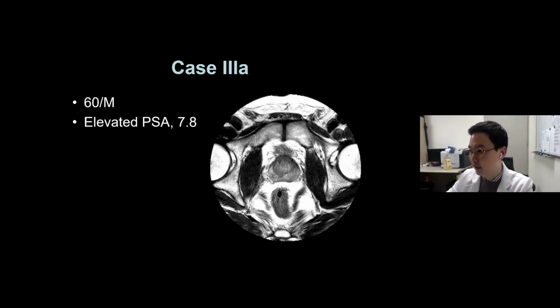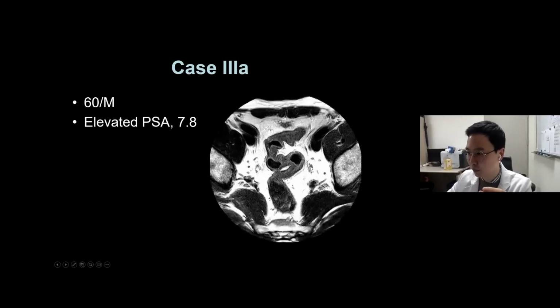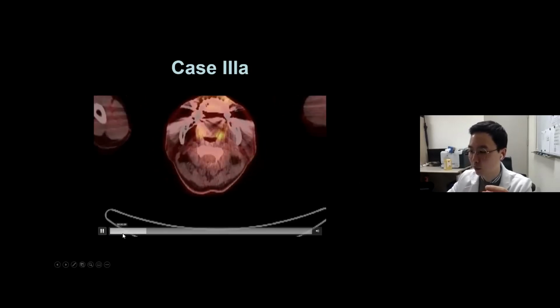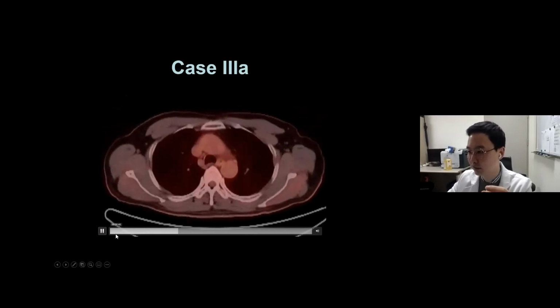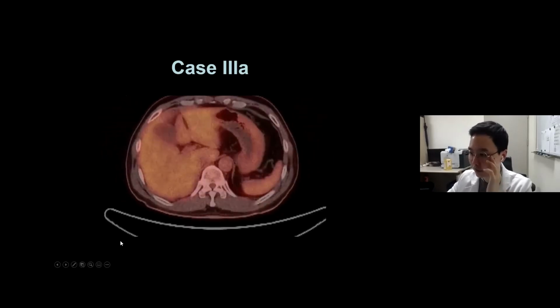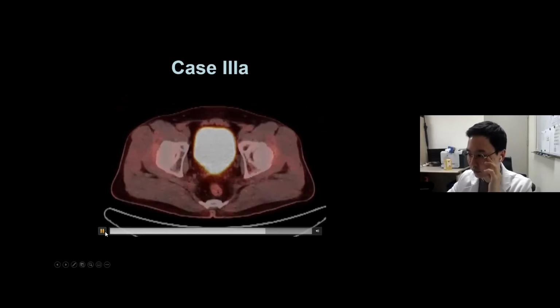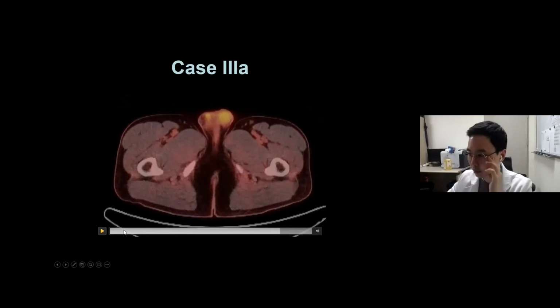And as the tumor focus was in the transitional zone, the standard sequence for evaluating this lesion was the T2 weighted image. So this patient underwent a biopsy, but before that, the patient had a PET CT for evaluation of distant metastasis or other lesions. But there was none.